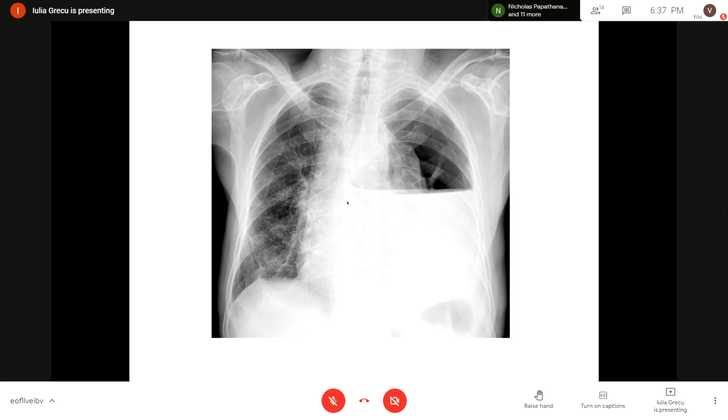So it's a mixture of fluid in the most dependent site, being opaque, of high intensity, homogeneous, and a lucency in the most superior part, corresponding to the gravity effect, which is lucent with no vascular margins, and which is delineated medially by this line, which constitutes the visceral pleura and the collapsed lung.